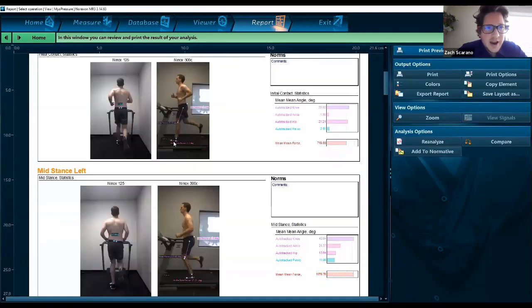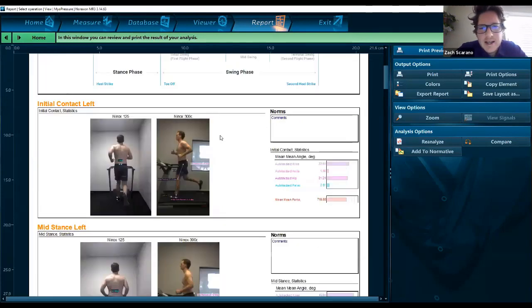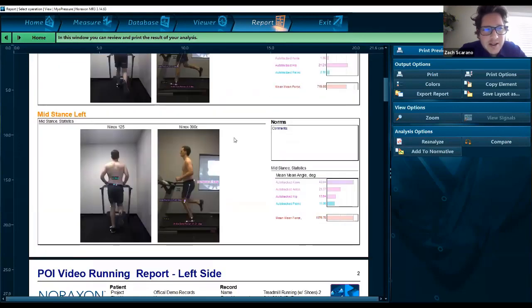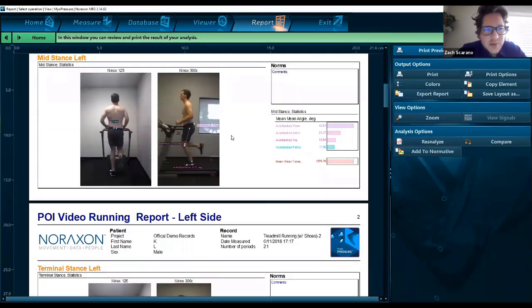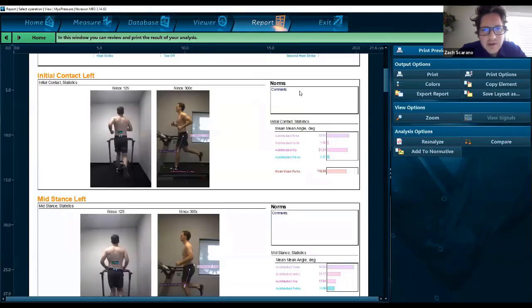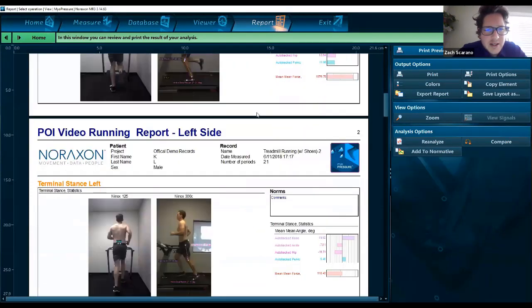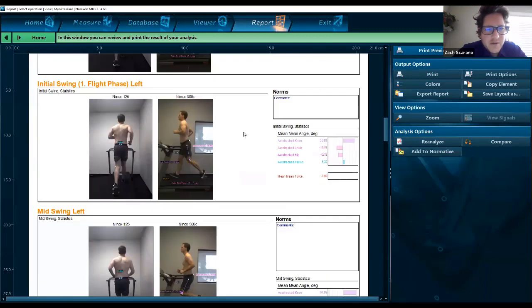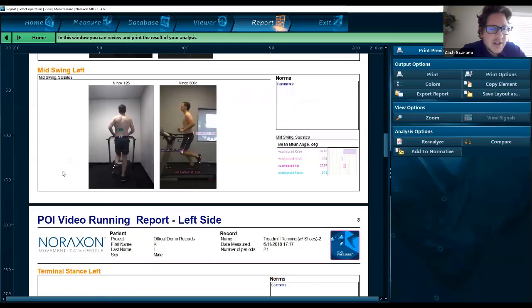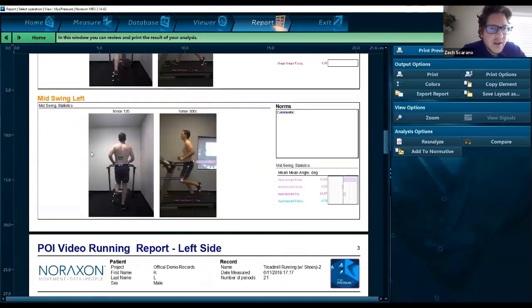So in this case, we now have our track drawings and the data that's associated with it for those different time points. The nice thing about this report is it demonstrates this particular activity in a nice dynamic context, gives you some options to enter in comments, and it's a very illustrative report for this, which automatically segments out the different phases of the run here.